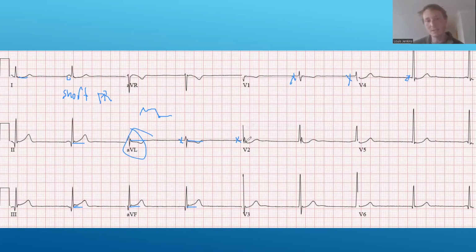We got some other changes in the ECG as well, like ST depression, and these strange upsloping T waves in V2. Again, we have that same sort of unusual morphology in V4, all relatively non-specific. But I think what could catch some people out with this ECG is that we do have quite consistent J point notching here. I don't know if you guys can see that.